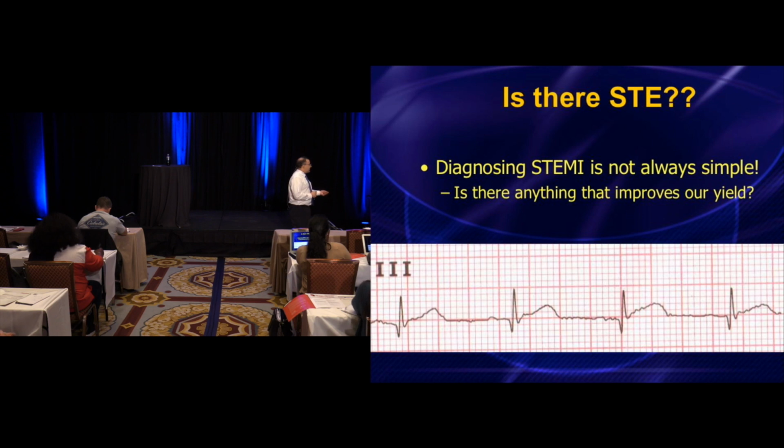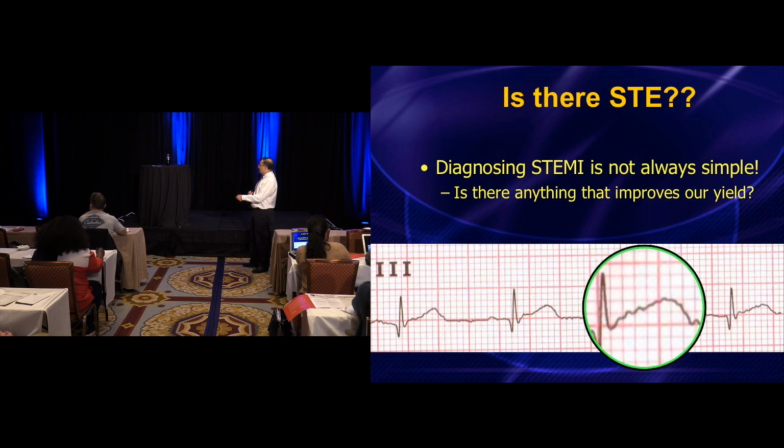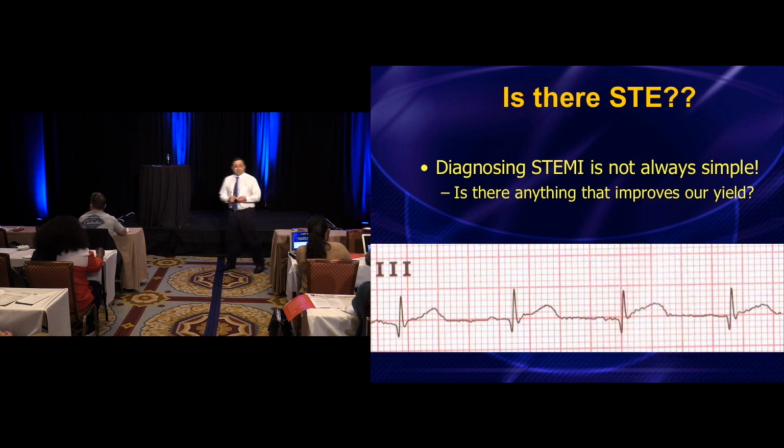But is anything else helpful? What do you guys think? Does that impulse right there give you any concern? Any thoughts?